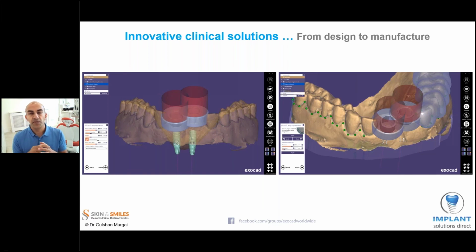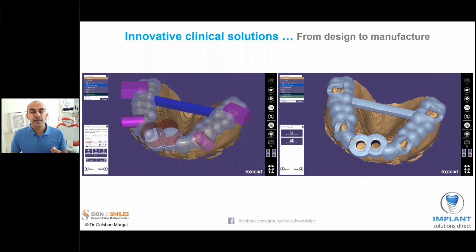So here the software has put what are called sleeve mounts onto the structure. So the X-ray data has now gone. On the right-hand side, you can see a partially designed guide. The red cylinders that are there are a protected area. It means you can't change anything or manipulate anything in that area, because that is the path of insertion of the handpiece, so that the practitioner can bring the handpiece along and know that there's nothing in the way of the surgical path, so to speak.